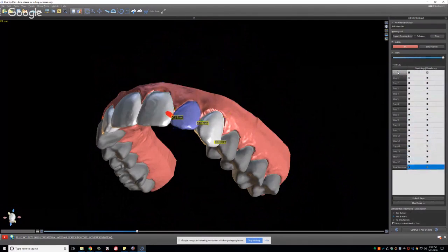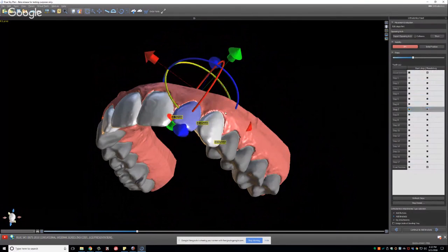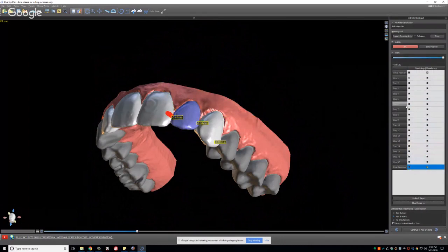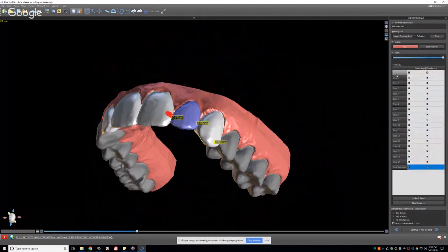And now you can see that the final IPR values are 0.4 and 0.35. Let's see if it ever gets above that. 0.45, it's a touch above. Don't love that, but we'll see if it gets any worse. 0.48, 0.46, starts dialing down. The worst is 0.48. I would probably just leave it as is here, but if you really want to improve it, you can just slide it to get away from that 0.48. Maybe come to here, click refresh steps, and now it never gets to that high 0.4 value.